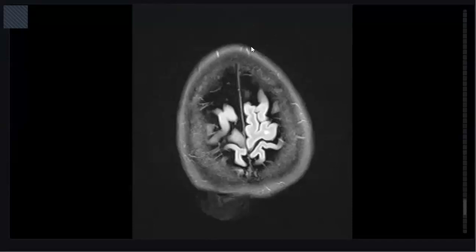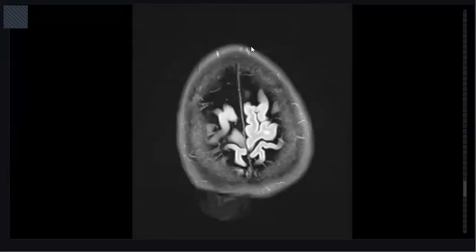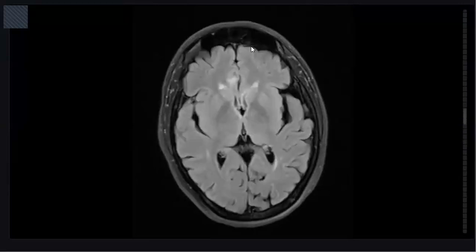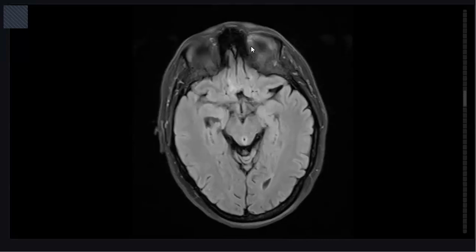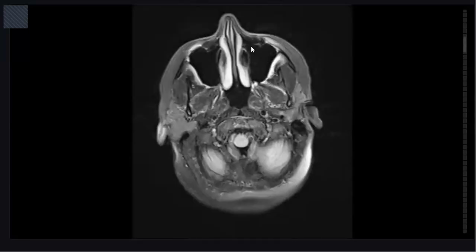This patient, 50 years old female patient, presented with ataxia. I'm presented by MRI study, axial FLAIR image of patient complaining from ataxia.